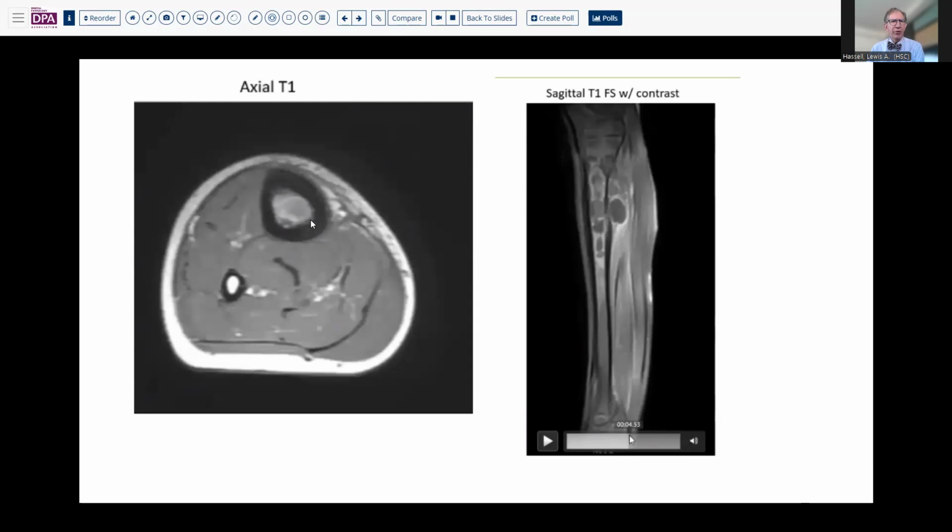However, as we get the radiographs, we discover that there is an irregular pattern, with variable density in his tibia proximally, as you can see here. In addition, there seems to be a soft tissue component to this that's somewhat rim enhancing. And the pattern within the bone shows a very erratic and sort of moth-eaten appearance on this T1 sagittal section.